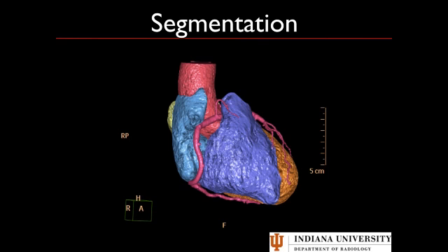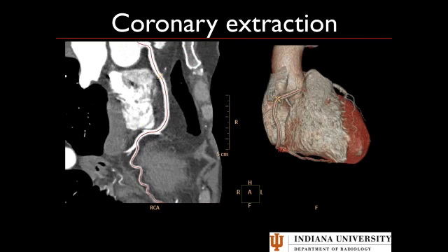Obviously, this is just the lumens, so the myocardium has been taken away, and these are just the residual contrast opacified lumens. You can see very nicely here the right atrial appendage and how high up it comes along the aorta, which most people don't realize. The coronaries then, they were already segmented before. You can highlight over them, label them, so you can say that it's the right coronary artery. For example, in this case, you get the volume rendered image as well as the MPR image. So the segmentation and performance and creation of MPRs has gotten easier since what I showed you before.